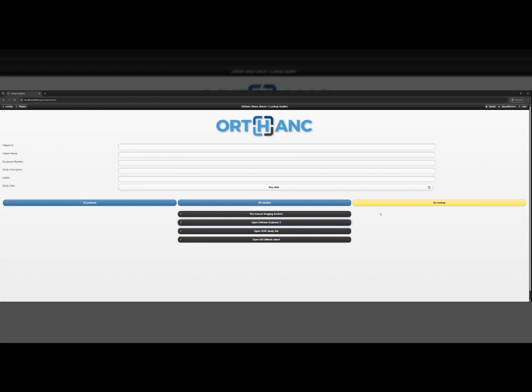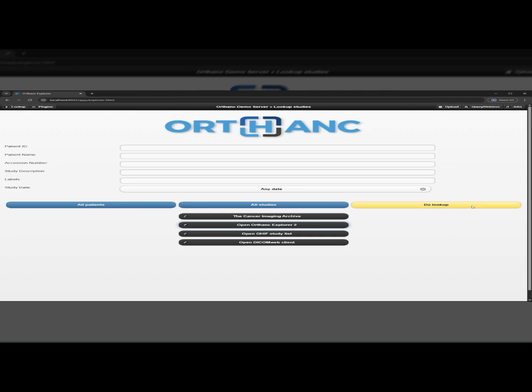Hi there. In today's video, we're going to look at the legacy Orthanc user interface, and we're going to compare it to the Orthanc Explorer 2, which we already have a video of on this channel. So if you haven't seen it, it is available. I'll put a link in this particular video. Now, how do you get to the Legacy Explorer?